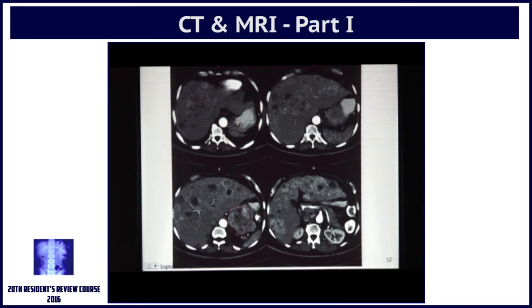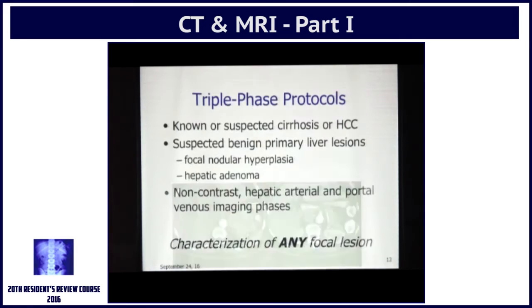Along with that fact, some of the metastases show necrosis, and therefore you can have fluid levels. You can see multiple metastases here, fluid levels. So if you have a patient with an enlarged liver, multiple focal lesions with hypervascularity and a fluid level, I'm not sure if it's documented anywhere in the literature, look at the rest of the abdomen and look for a hypervascular primary carcinoid tumor.